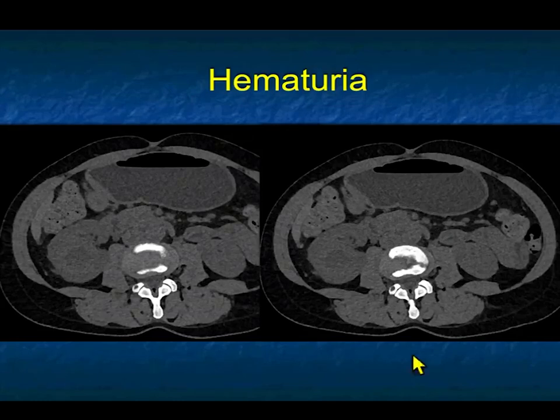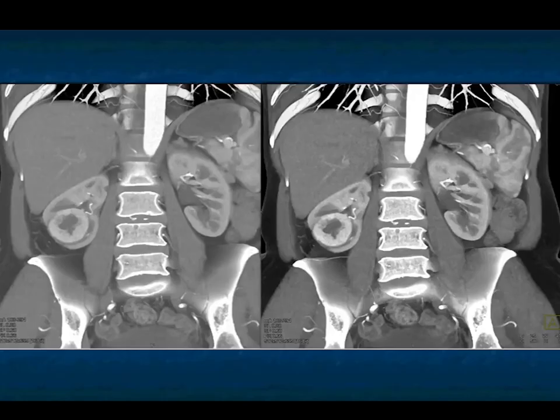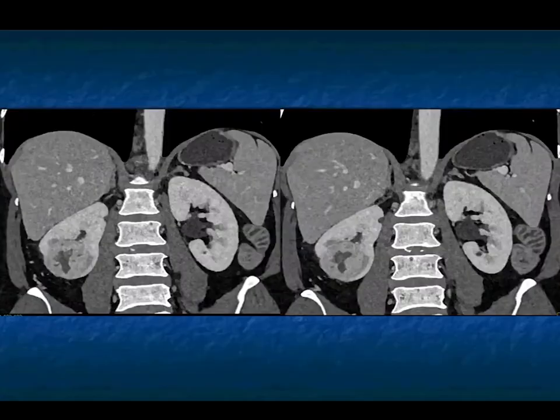If you look hard, you can see a low density zone in the patient's right kidney. You give IV contrast, beautiful example of a hypervascular mass. Now, there is a central scar or necrosis, so you could think of an oncocytoma. Very, very well defined, so an oncocytoma might be a thought. But again, it's renal cell till proven otherwise.